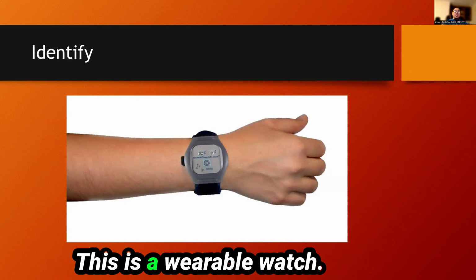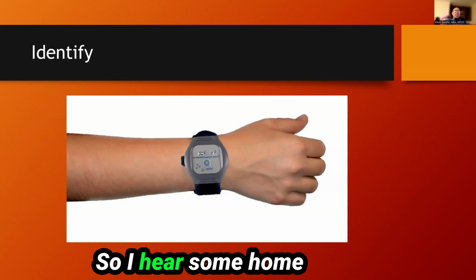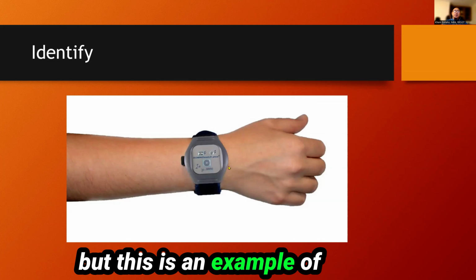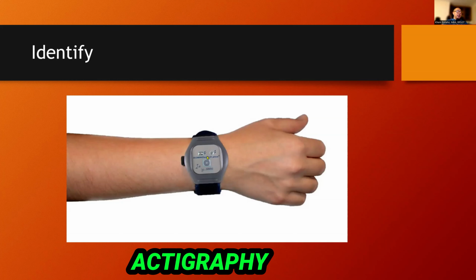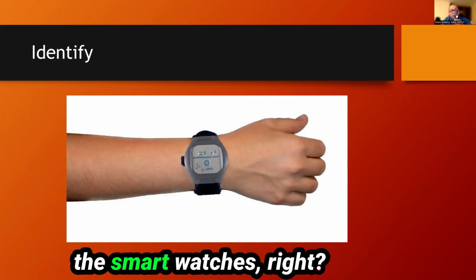This is a wearable watch, of course. Okay, good. So I hear some home sleep studies, wearable watch, but this is an example of an actigraphy. Most actigraphy, in fact, right now the most common actigraphies are your watches, the smart watches, right?